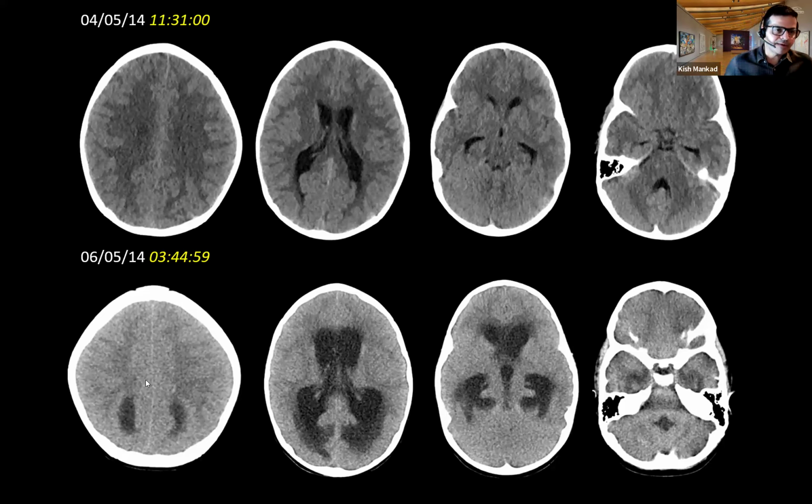In this unfortunate case, of course, between that time point and this time point, a lot must have happened and gone unnoticed, but a neurosurgeon would not have gone ahead and shunted these ventricles. That is also for sure a definite statement to make. So time is of the essence, but time is brain, we know that. But importantly, getting the context right and doing the right strategy for management is important.